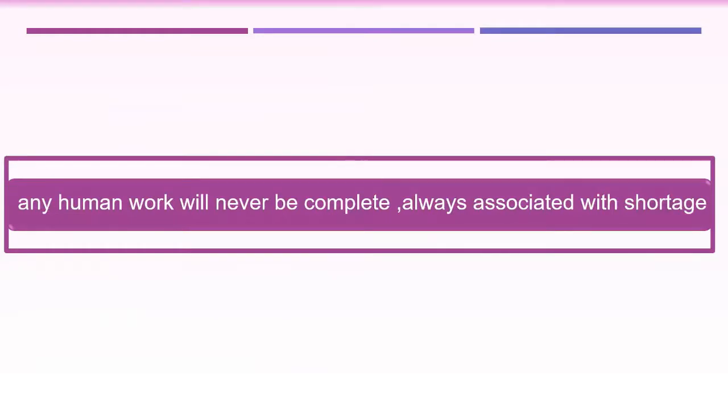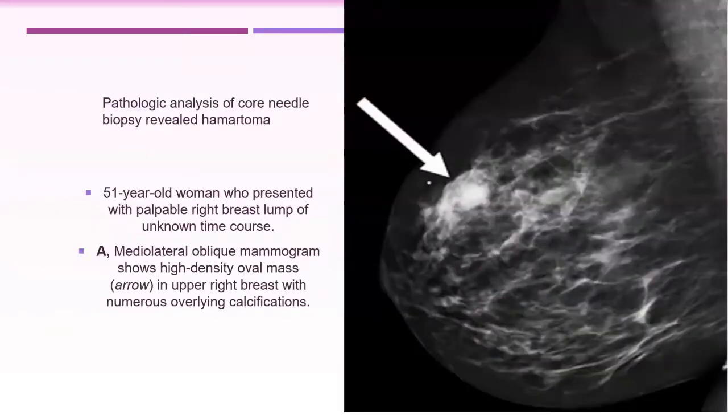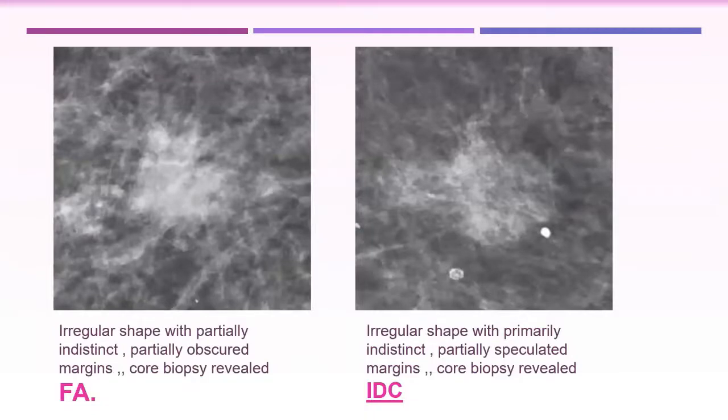Dr. Rabab, sorry, the fibroadenoma, I couldn't appreciate the microcalcifications. Yes, it is not very clear, but it is there. There are microcalcifications. Okay. It is amorphous. That is why it is not very easy to detect. Yeah, I could see it here close to me.